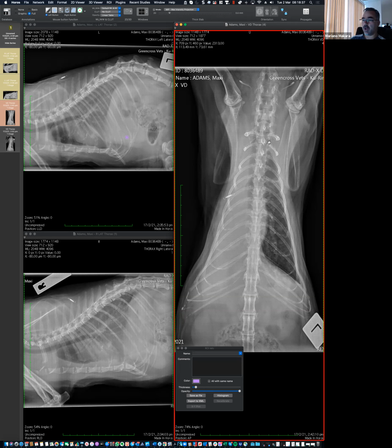By the way, before we continue, I completely agree with that comment about the pleural effusion on the left. I think there is minimal, but there is separation of the lung. There may be a pleural effusion line there. So yes, going and getting the pleural effusion, and I completely agree with the comment.